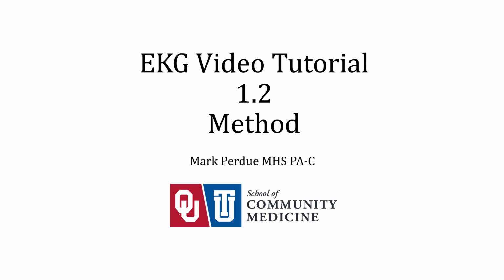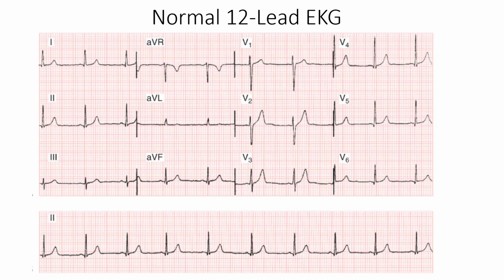Welcome back. In this last of the 1.0 series, we're going to learn a systematic method for interpreting EKGs. So behold the normal 12-lead EKG.